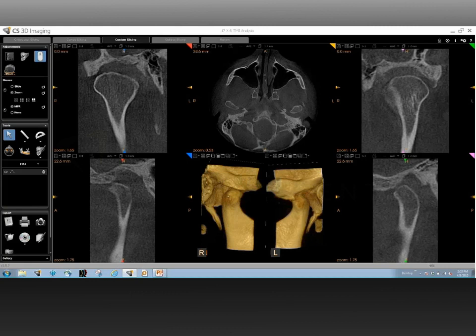Now, besides the condyle, there are one or two other structures that are very prevalently seen on a scan, and one is the articular fossa, where you see the nice curved structure above the condyle. That is the articular fossa. The space in between is where the disc occupies, so that is referred to as the interarticular space. And besides that, if you look at the lateral view, you can notice the eminence, which is nothing but the articular eminence. This is visualized bilaterally. The eminence is a very critical component to the TMJ, since most of the TMJ movements are related to how it's oriented with the articular eminence.